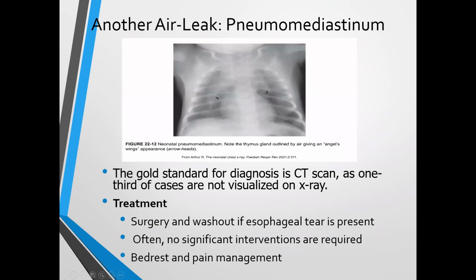Another air leak syndrome, pneumomediastinum. The gold standard for diagnosis of a pneumomediastinum is a CAT scan. I will show you one later on; I do have one in this presentation. One third of cases are not visualized on the X-ray because of the 2D versus the 3D.